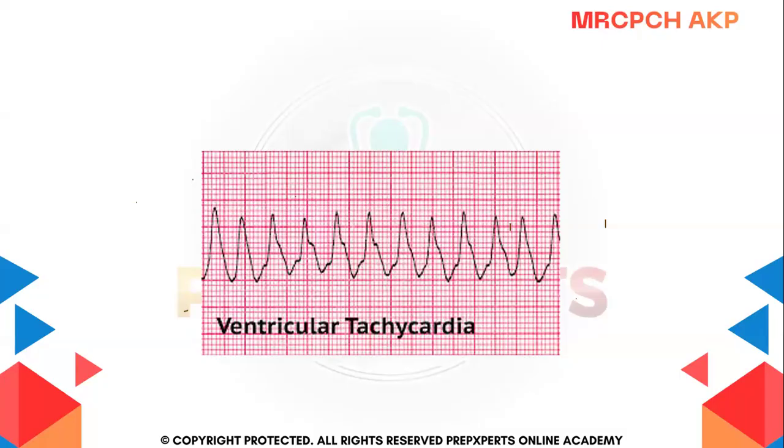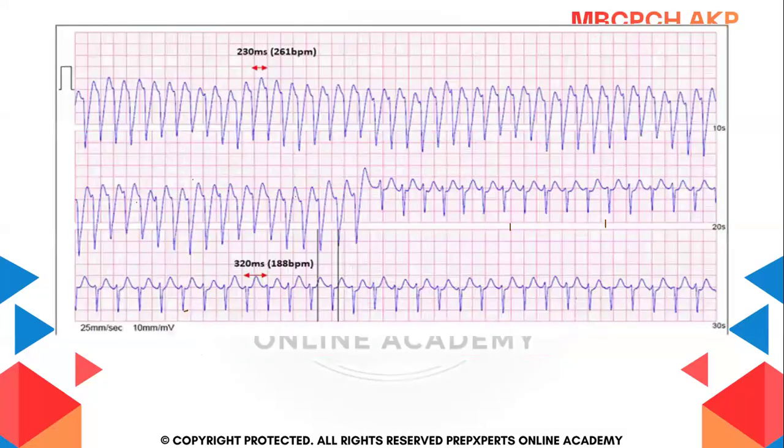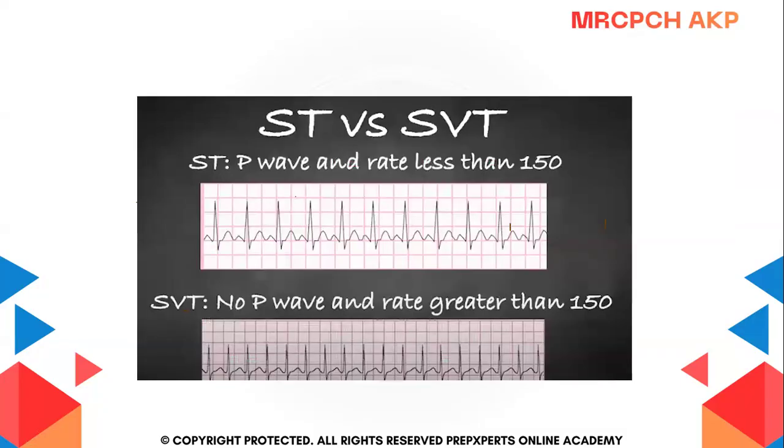You will see it will be very easily picked in the exam. Medically, the finding here is a wide complex tachycardia, and simply put, you will see these small mountains, so you can say this is a case of VT. Comparing it with the other conditions becomes very easy. Again, you can see these mountains, these little mountains.